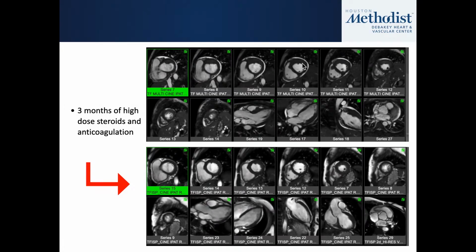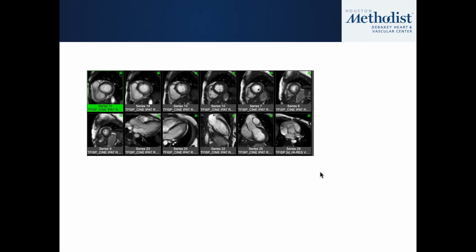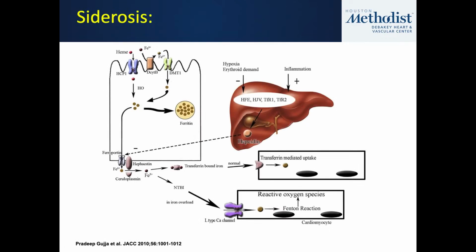And you'll notice, compared to the initial scan, when she's brought back for follow-up imaging at 3 months, that focal increase in wall thickness in the anterior wall now seems to have resolved. And when we do delayed enhancement MRI, we can see now there's not that classic three-layer pattern of enhancement that we saw before, of enhancement, hypo, and further enhancement, except for in this small little area right here in the anterior wall. So it looks like most of this has actually regressed with therapy.